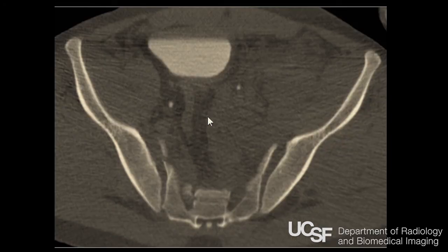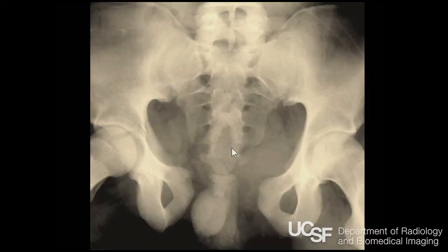Okay, when we get to the pelvis, there are a number of different injuries that we have. This would be an anterior compression injury. You kind of split the anterior sacroiliac joints bilaterally, you have diastasis there. If you see the symphysis pubis more than 2 centimeters, the patient's probably bleeding to death, and this person needs to be bound up. They need to be wrapped together with this mechanism to stop the bleeding. Angiography, if you need it, comes after, but first they've got to be bound together. So talk to the emergency docs and say, we've got a very wide symphysis pubis, get ortho down here to put a binder on right away.